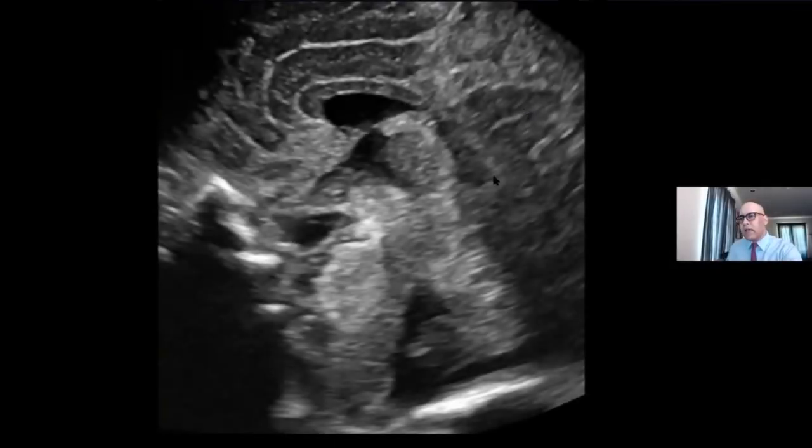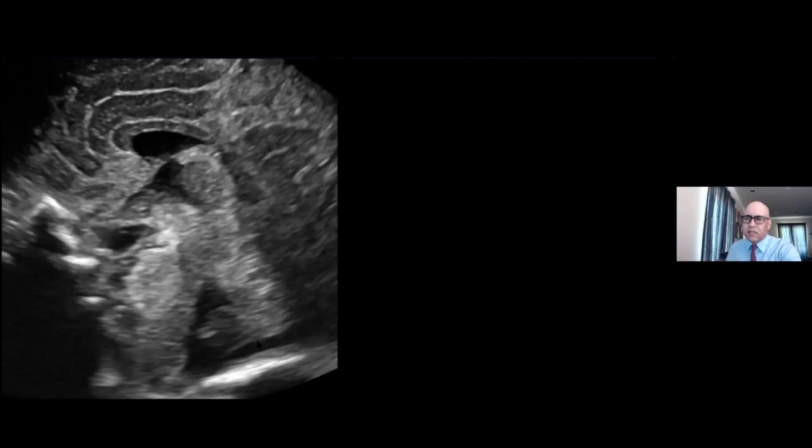This is a head ultrasound on a newborn that had an abnormal fetal ultrasound with concern for an abnormal development of the posterior cranial fossa. And similar to the fetal ultrasound, it can be difficult to fully characterize the cerebellar vermis. Here's the fourth ventricle, and this is the cerebellar vermis, and it's hard to know where the cerebellar vermis stops. So this is definitely a time where MRI is more beneficial.